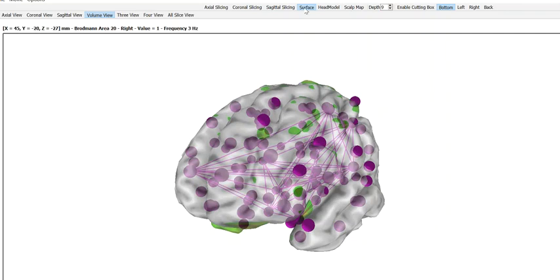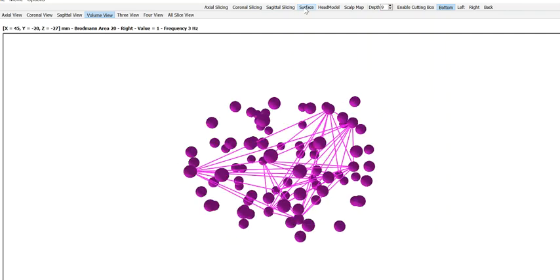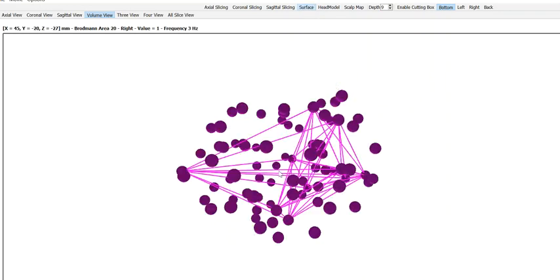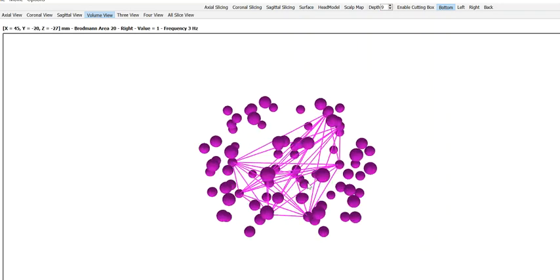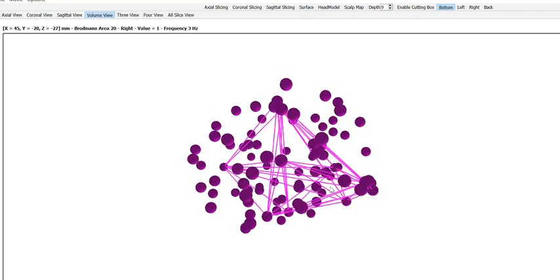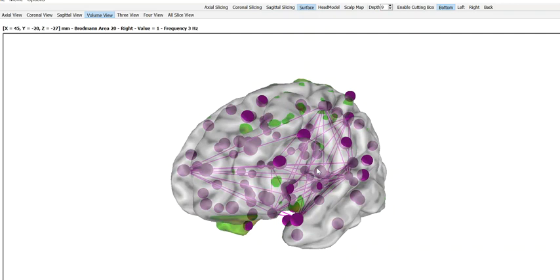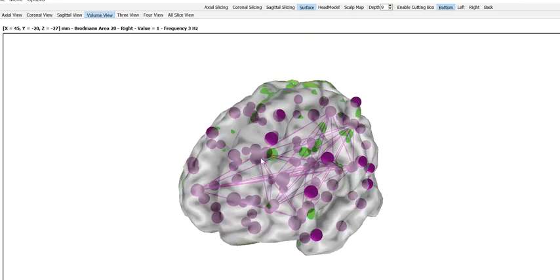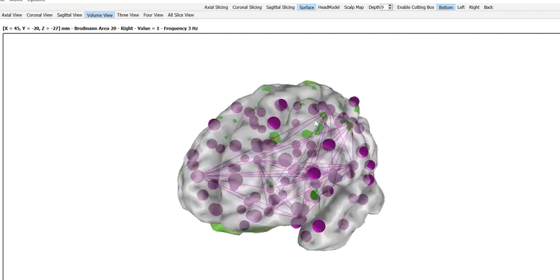With the various tools inside of NeuroNavigator, we can make the skull completely transparent and then just look at the nodes in the network. You can go back and forth, rotate just the nodes in the networks. You can select particular networks based upon the symptom checklist and the networks that you select, for example, the anxiety network, the memory network, the mood network, etc. And then you will limit the number that you will see, because this is the full 88, and it is not as useful as identifying subsets based upon the networks that are linked to the patient's symptoms.